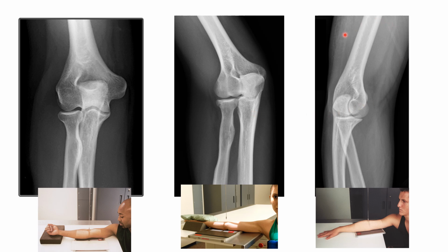And this next image here is the internally oblique elbow. So internally obliqued or medially obliqued elbow position. So we can see a big difference between the AP, the external oblique, and the medial or internal oblique. There's a big difference here because we know that the radio-ulnar joint allows for a pivot type motion.